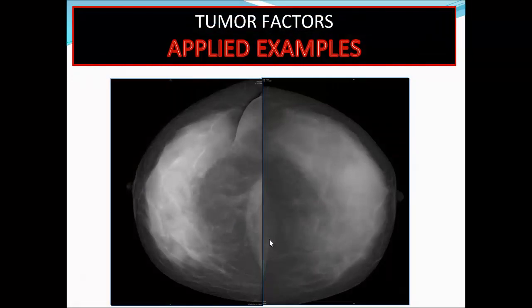Okay, let's take a practical example on this talk. Here we have a breast. Here it's not so good technique. This is the pectoralis muscle, but the pectoralis muscle here is not seen. This is homogeneous breast density, but here, is there any abnormality?